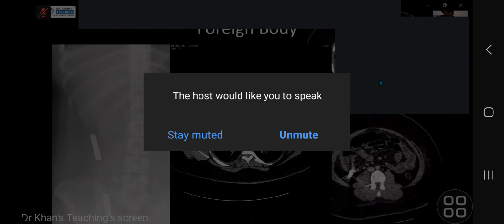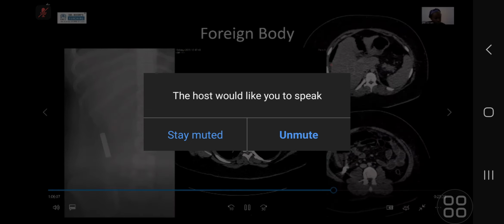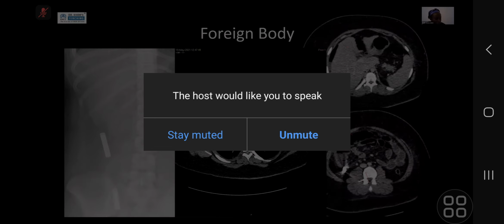And you can see that she's got pneumoperitoneum in the abdomen secondary to this. So she actually perforated. And normally with AA batteries, we don't tend to worry about them in the UK. We just watch them for them to pass. But they can erode through, as we can see in this case.